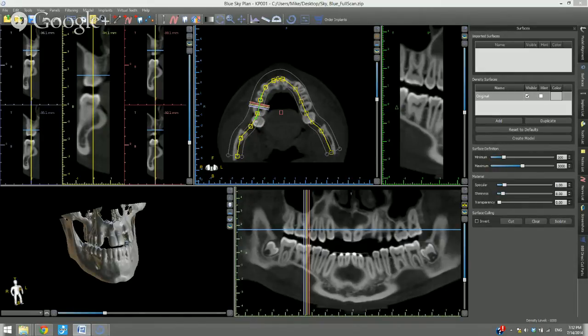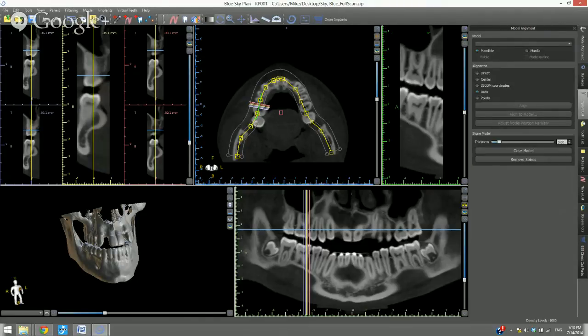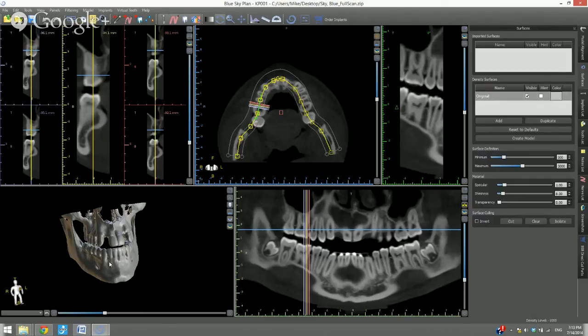Okay. What we have on the right side of the screen is our different panels. You could think of the panel as a miniature control panel that deals with a particular type of functionality. There are 2 different ways that you could open a panel. One is you could go down here and this lists all the different panels. You could select the desired one and open it that way. A different way of opening it that I find to be more intuitive is just by double-clicking. Whatever you double-click on, the relevant panel will open.